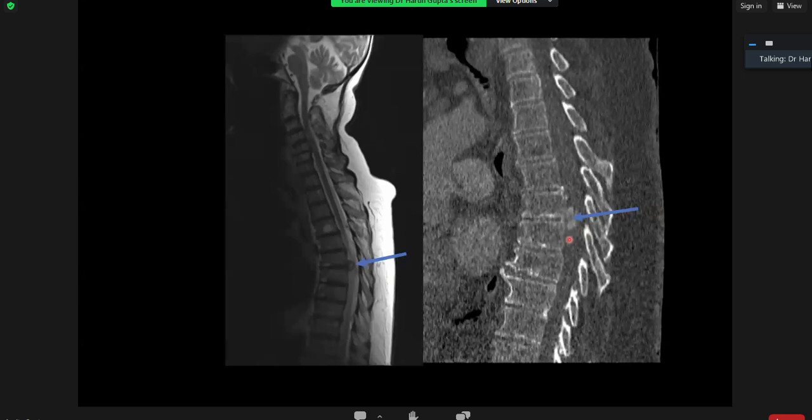That's what we do in our practice because we always find that these have large calcific component, as in this case. So when you look at the cervical spine, when the degenerative changes happen, it's disc osteophytic changes. Along with disc, there are osteophyte formation changes. Whereas when we look at the thoracic discs, when they are large, they're associated with calcific component.